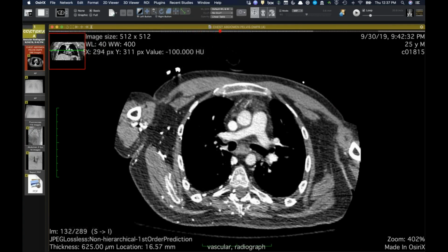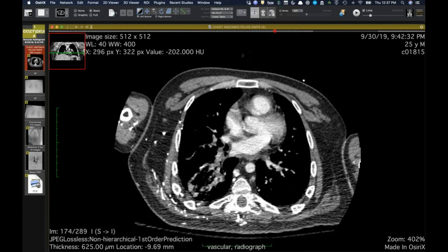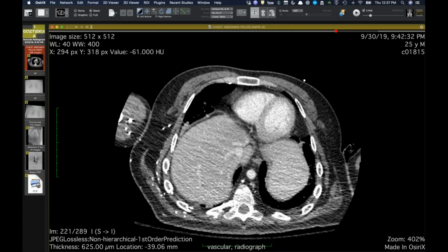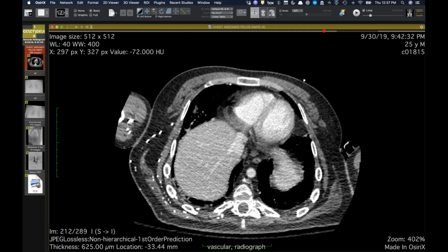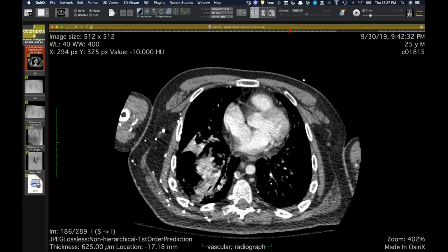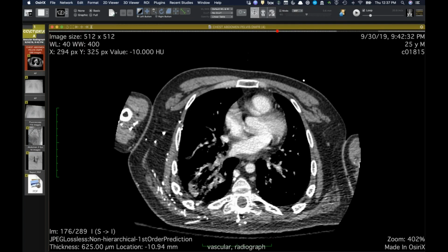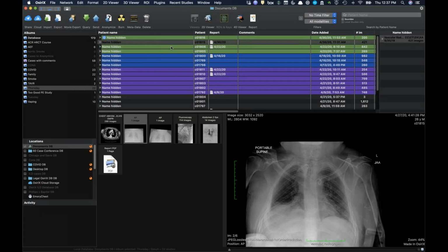I did hear you use that term. So down here would be, I guess, hemiazygos below when it crosses. Yeah, that's right. And that's accessory hemiazygos up there. Very cool, and very ironic that I have that case to show too.